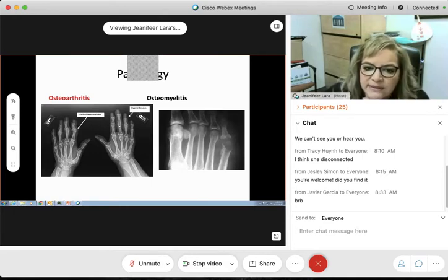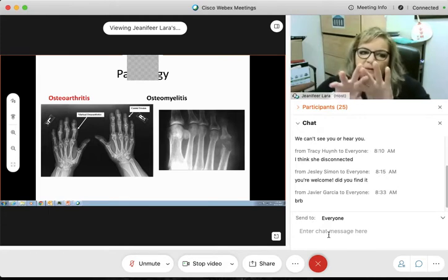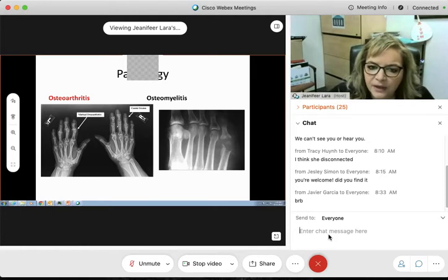But if you start to progress distally, we start to see a change in shape. The outlines don't look as sharp as normal anymore. It starts to become hazy, blurry in a sense, and kind of spreads out a little bit. Those are the signs.